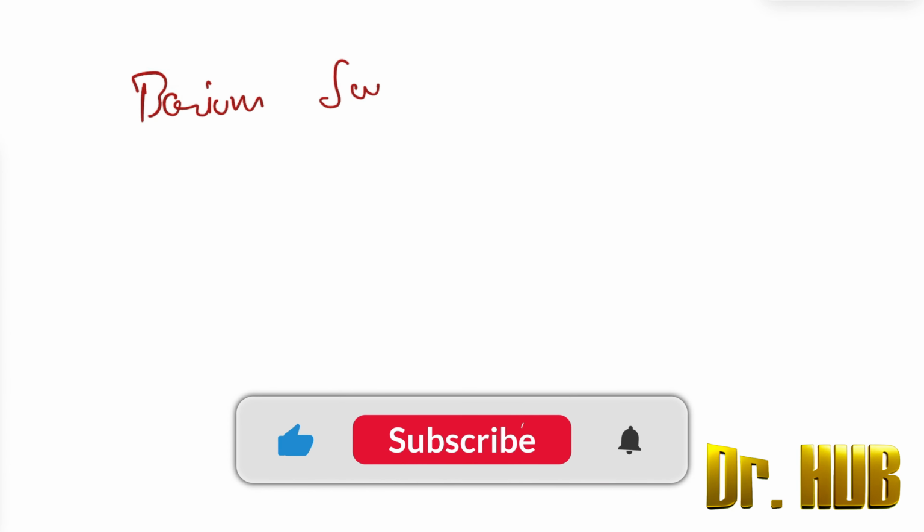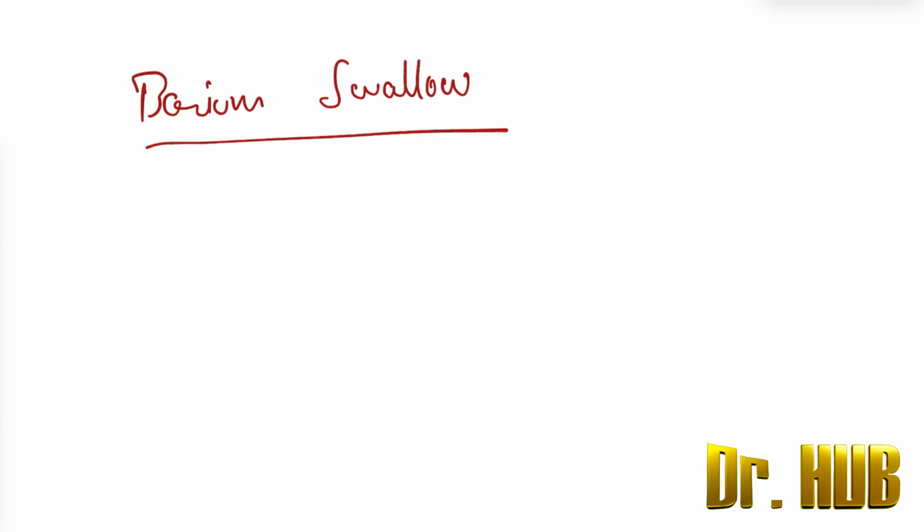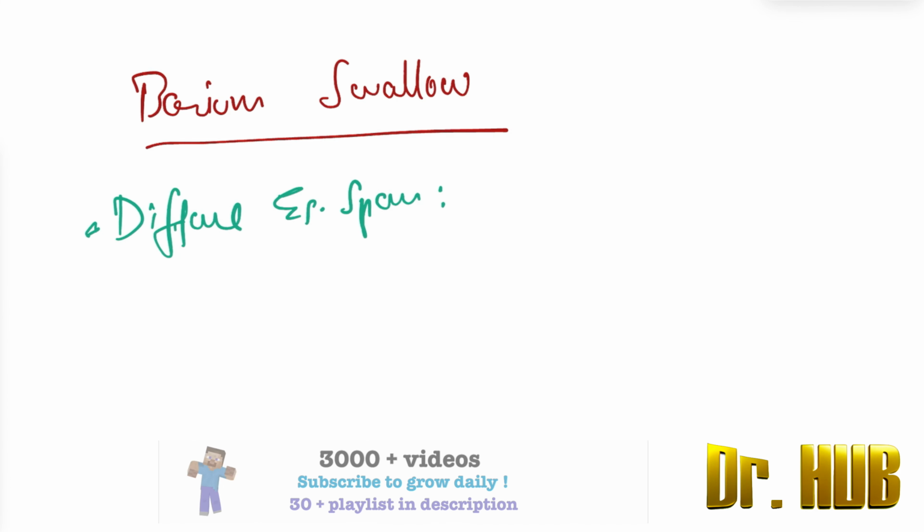The barium swallow. Under the barium swallow, we are going to see some conditions and how they appear. How does the diffuse esophageal spasm appear? It appears as a corkscrew appearance.